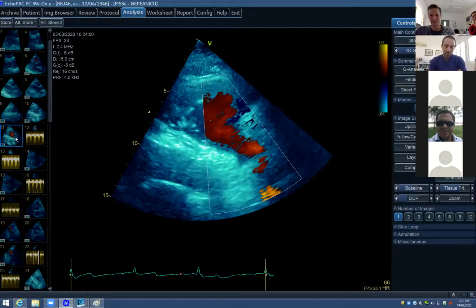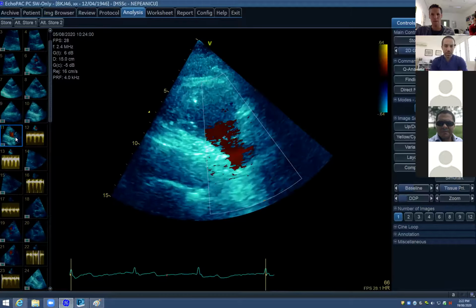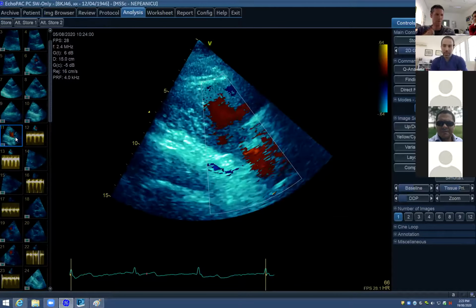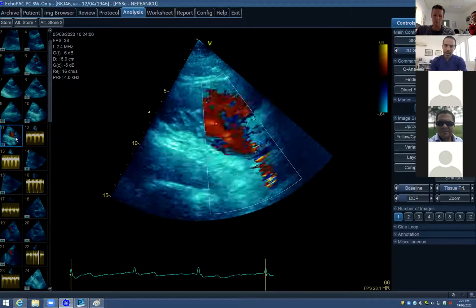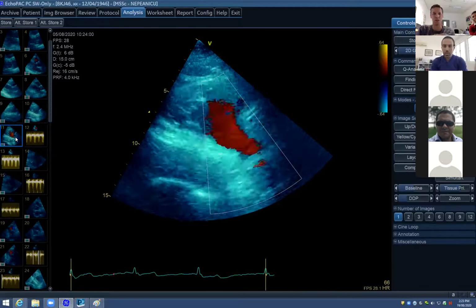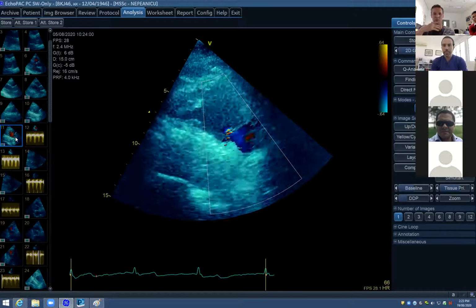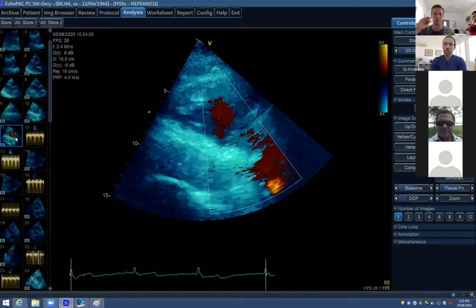So what I want to do is get an apical 4-chamber, shooting through his tricuspid valve and seeing what the TR jet looks like, and then get the maximum velocity from that, and generate what the pressure is from there, and add his right atrial pressure. Is that what you mean? Very good. So absolutely right. Apical 4-chamber, we can look at our tricuspid regurg jet and its Vmax, and we add on our right atrial pressure estimate, and we can talk about doing that based off the IVC and the hepatic vein, and we'll maybe talk about that a bit later.